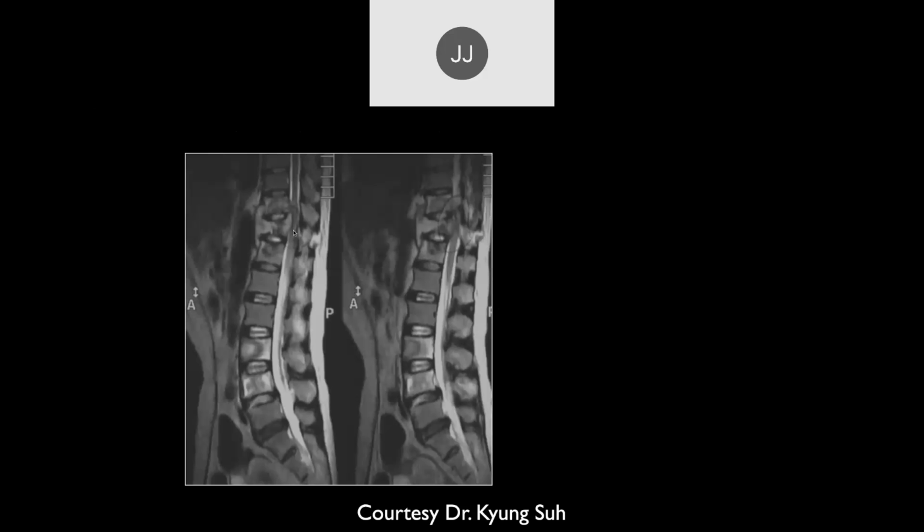Now, if we get to the tumor section, what I'll say is if you see bowing of the posterior cortex like this, that's highly suspicious for malignancy. What this represents is a lot of chronic destruction of the trabecular bone, which weakens the vertebral body, allows bowing out of the cortex, and then later the cortex may fracture.